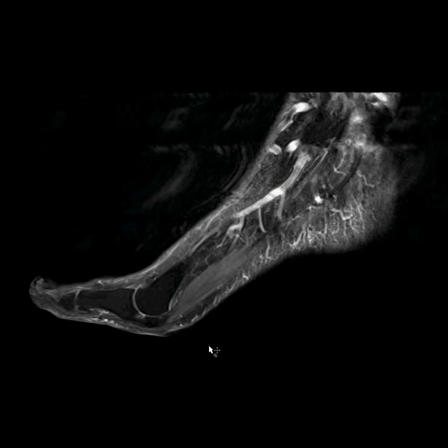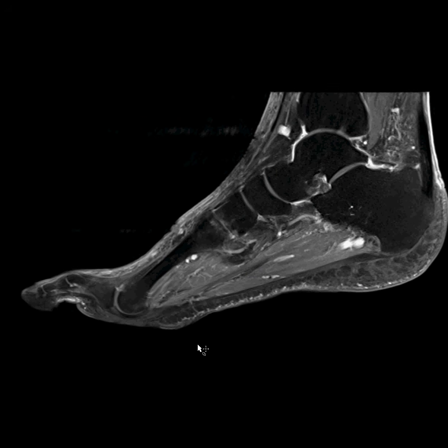So imaging plane is an important choice to make. In this case, I think that it's important for a technologist to recognize where ulcers are, either by looking through the medical record, by talking to the patient and having them point it out, or unwrapping and looking at their foot directly. Any of those things can help reveal where those ulcers are and make good choices about imaging plane.